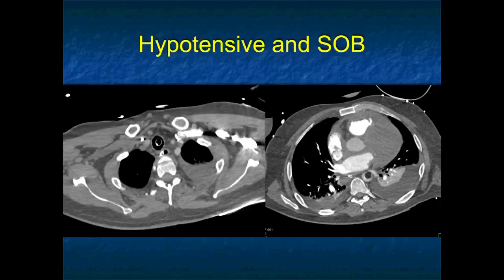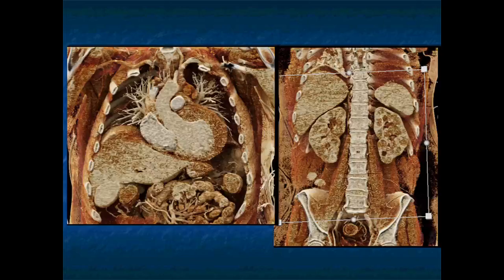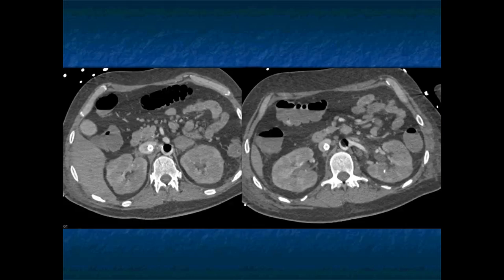which I quizzed Stefan on yesterday. Patient came in hypotensive. You can see heroic measures were made. There's infiltration of the left ventricle. It's markedly thickened. What's causing left ventricular thickening? Could be amyloid, but it's more on the superior portion. We see the thickening. And then as you go in the abdomen, another good look on the cinematic of the thickened LV wall. But the patient also has enlargement of the adrenal glands.